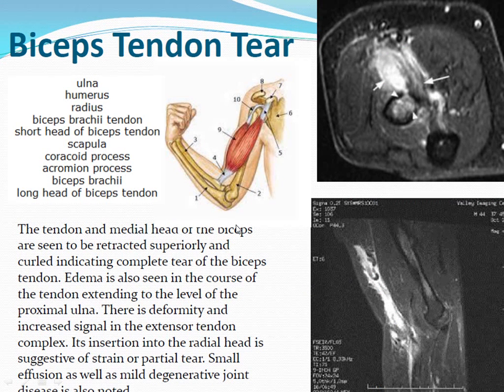This is showing a biceps tendon tear, quite a bit less common than a rotator cuff tear. It usually takes quite a bit of force, usually on a degenerated tendon, to cause this biceps tear. You know how you flex your bicep, like you're showing your muscle. If you exert this forced flexion on a heavy weight or something like that, and the tendon is not in great shape, say with an older patient, it has a chance to rupture.